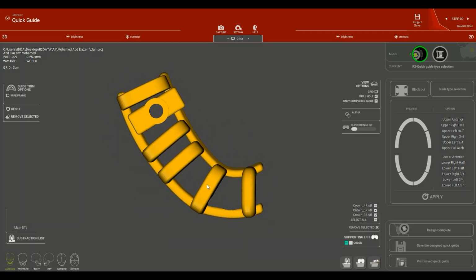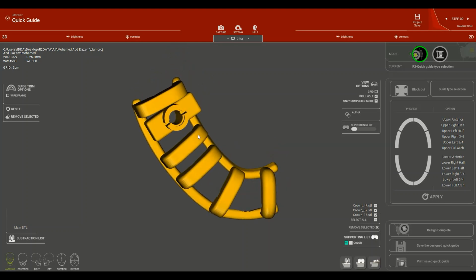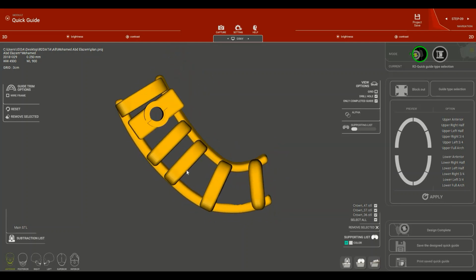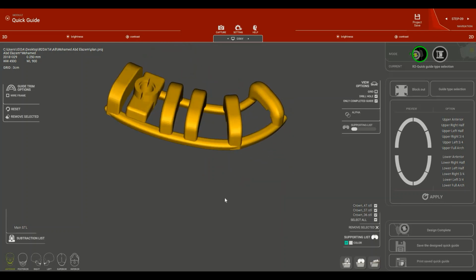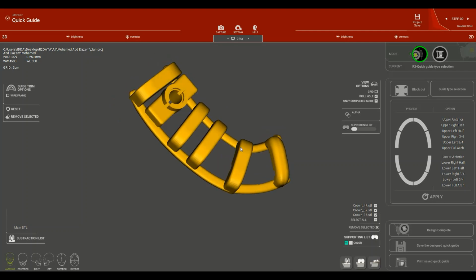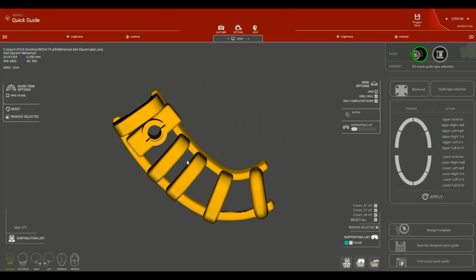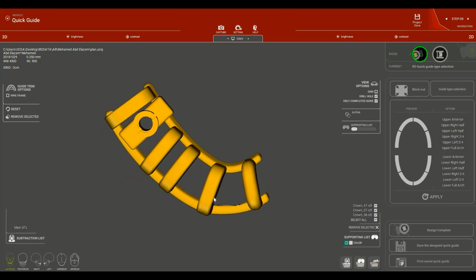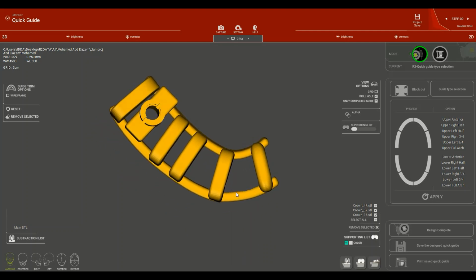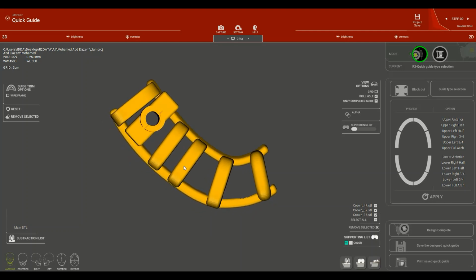function actually works. I just need to give you a quick reminder that we're actually in the phase of testing this function, so we'd definitely like to hear your feedback. It's a new type of surgical guide design. It's an open frame type of guide. So if you do like the design of the open frame surgical guides, just let us know in the comments of the R2GATE experts group or in the R2GATE YouTube channel.